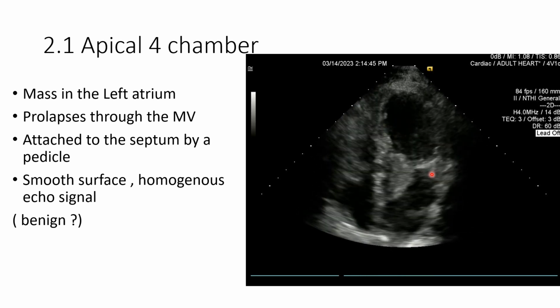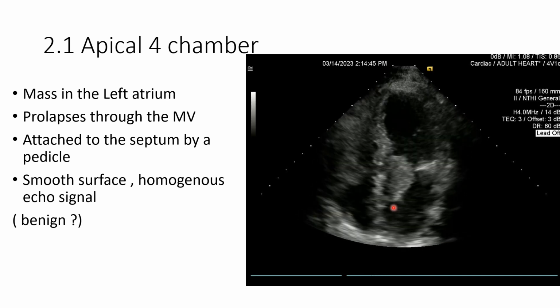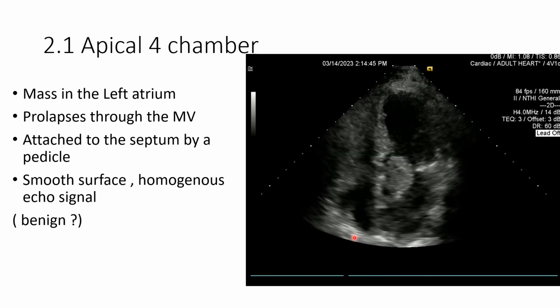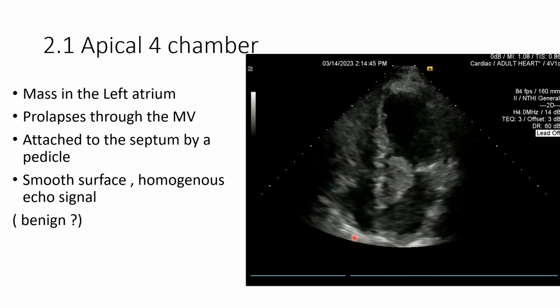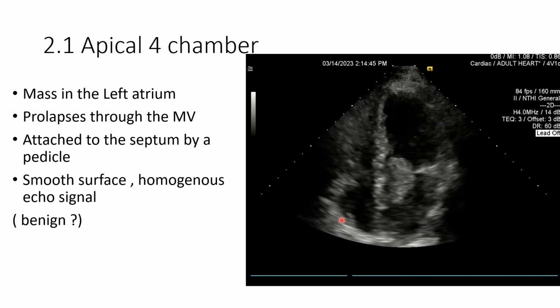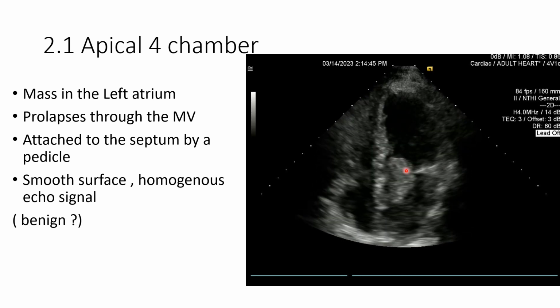It also gives us an idea about the surface. It is not shaggy. There are no significant areas of necrosis, and there are no areas that are prone for embolization. So it is more or less a tumor benign in origin.